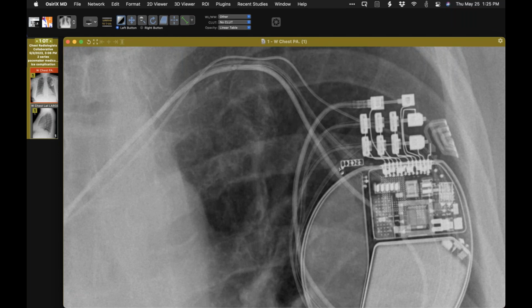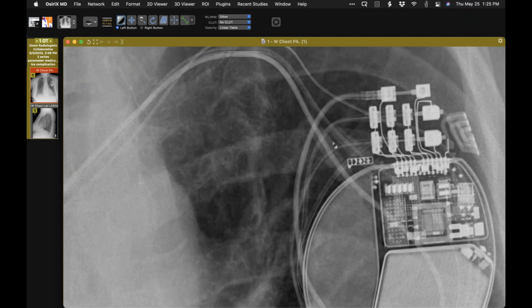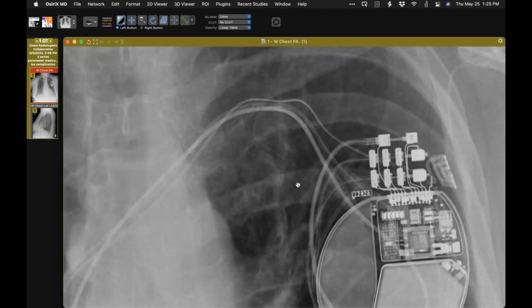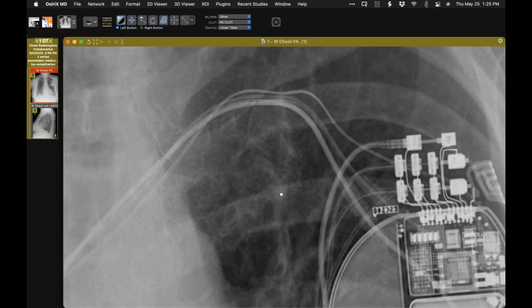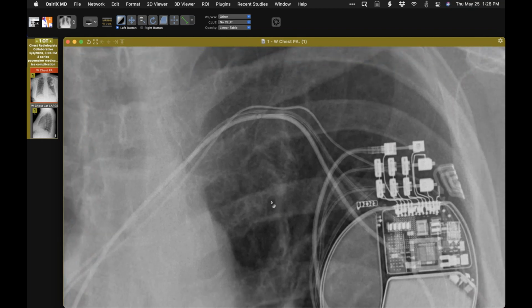Now, of course, here we can see the suture sleeve, so that's not the issue. And you can see there's no constriction. So sometimes I've looked at that and wondered whether there's an abnormality, but I'm not sure otherwise, Jeff. Okay. Some of them, the insulation has little segment rings, and I have a case I'll show where, as it bends, it changes the distance between them, and it can look like a discontinuity. Yeah, I'm sure there are cases where one isn't sure.